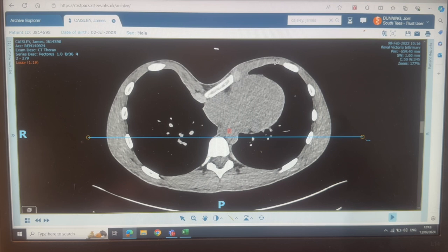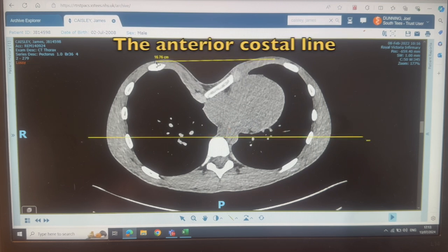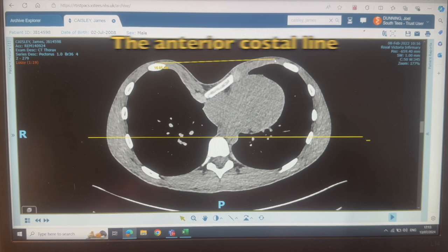There's also going to be a measure from the front, the most anterior piece of bony chest wall or cartilaginous chest wall, to the most anterior on the right-hand side. So I look for a piece of bone at the front, or where that piece of bone would be if it was in the middle. So it's not muscle and it's not fat, it's bone or cartilage, and that's a bit of bone or cartilage. Now I'm doing that one because we have to measure a dip depth as well.